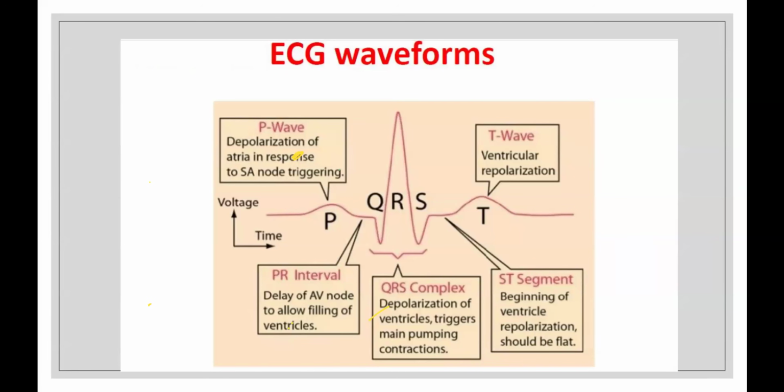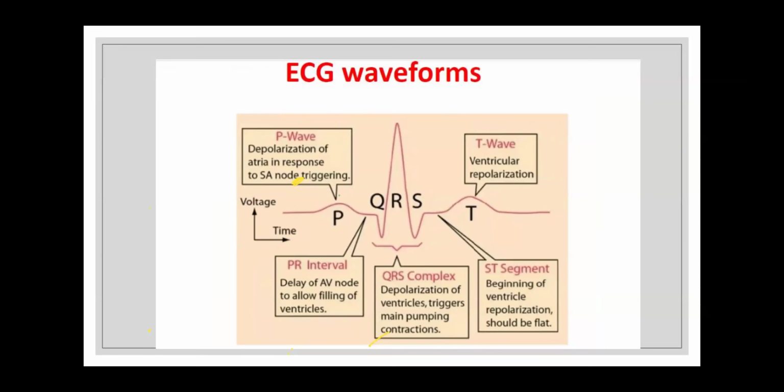So when the ECG starts, we already discussed first the P wave appears. This is the P wave. Okay. First, the P wave appears, and the P wave basically tells you about depolarization of the atrium. Atrium first, the atria. So atrium depolarization is shown by the P wave.